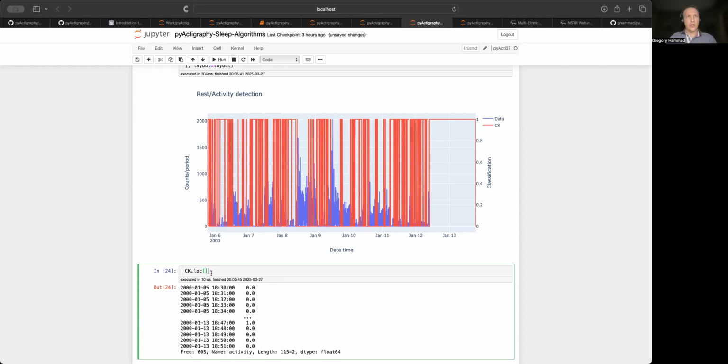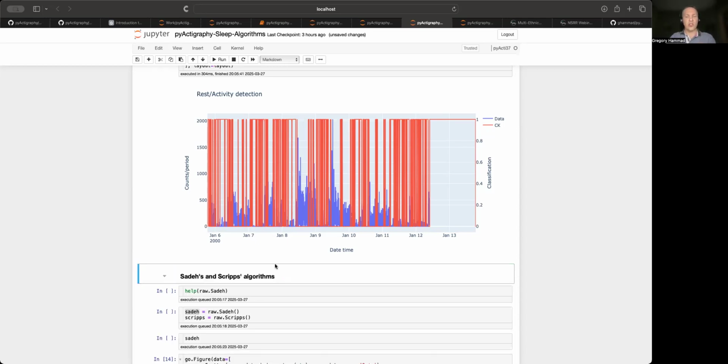You can actually change that, but I do admit that it's a bit cumbersome. It would be nice to have a visualization where you can scratch. This is what I said at the very beginning: also for the masking, having something visual where you can just click and say, from there to there, I want to mask. That would be extremely useful.